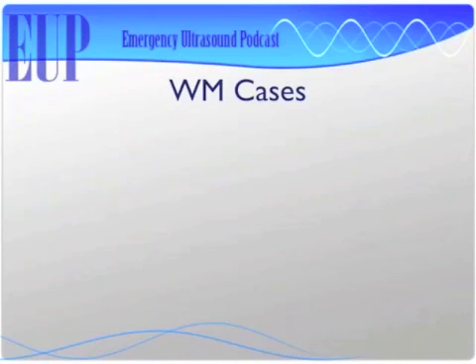And I think hopefully these cases have shown us that it's really not that hard to use. I mean, it's pretty obvious. Seems like it, yeah. It might not be nearly as important as we're implying that you know which wall is which and all of that. But if you can get the idea of what the coronary artery distributions are, that's 90% of the battle.